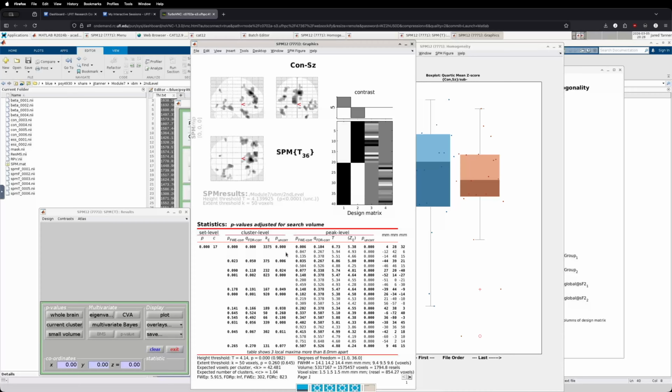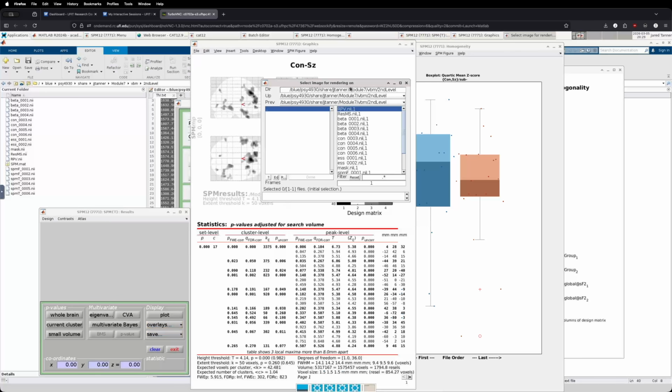And so this gives you a whole output, a table. This table could actually be output almost ready for a publication, for a submission. And go back to the overlays on this section. We would need to get back to that location. So share data, NeuroTools, and go into the SPM12 folder, canonical. You could load any of these, but we'll load the single subject one.